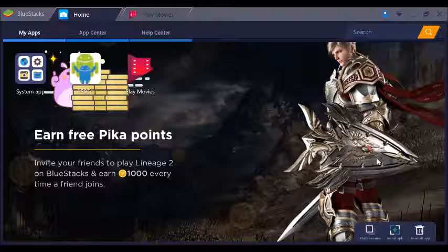Now, if you click on that, a standard Explorer window will pop up. You can navigate to where you downloaded the APK, and you can install it directly into this environment. So basically, you have an Android app installed on your Windows machine. I've already done that. You'll see here there's an icon. It says PPDT1, which is the name of it. I didn't take any time to create a nice icon or even change the default name of the app. So this is what you get.